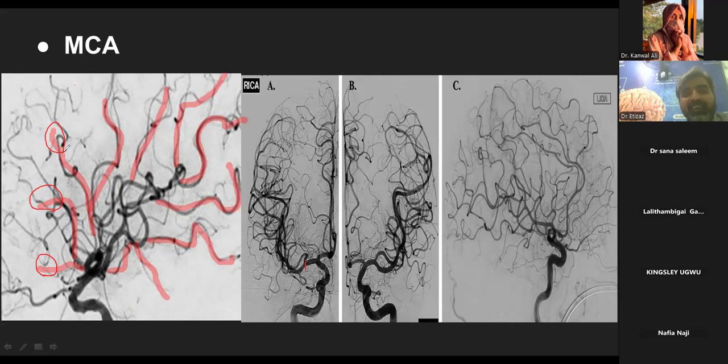This is pre-central or pre-rolandic artery. Look at here. This is the central sulcus. Okay. This is pre-central artery. This is central artery. This is post-central artery. Or sometimes you can say it is the anterior parietal artery. This is posterior parietal artery.